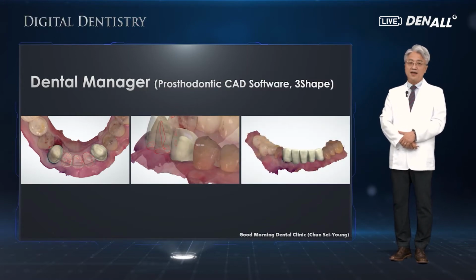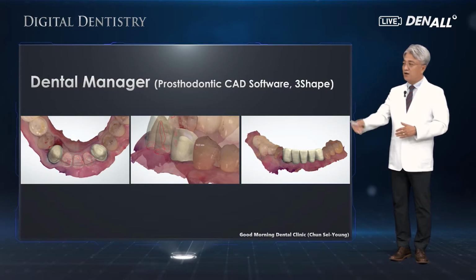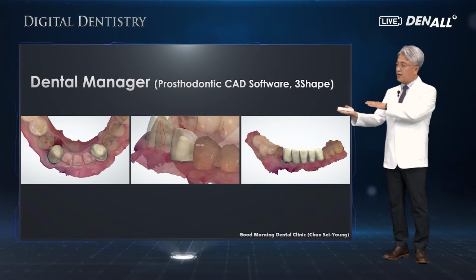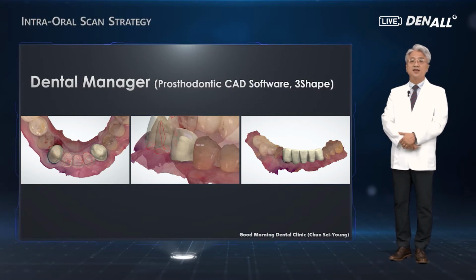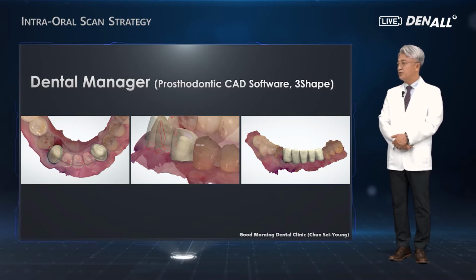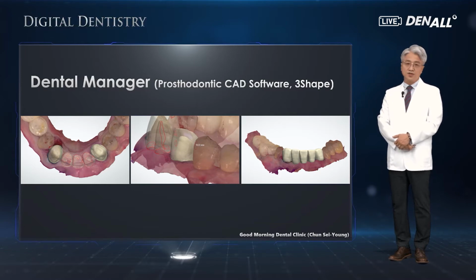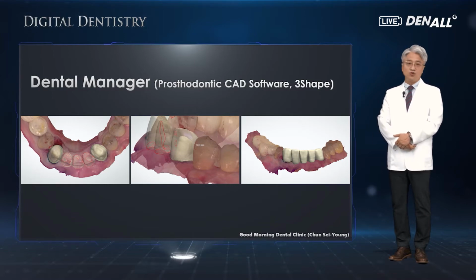This is the process of designing for a pontic or crown. Just like this, the adjacent tooth contact point and the contact of gingiva below a pontic are not estimated by a person but reproduced very accurately using measurements. Thanks to time saving and precision, we can do our clinical work easily and comfortably. The digital designing makes our clinical work very precise and convenient. It's very helpful in solving many problems.